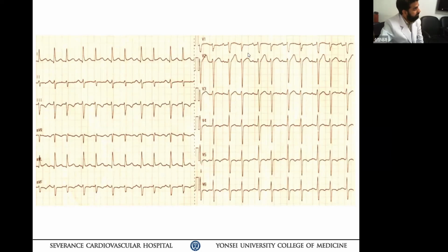Yeah, it's a narrow QRS, but slightly wider if you see one. Can you measure? I cannot see the grid. It's longer than 120 milliseconds. The first and second QRS look different, slightly short, around 20 milliseconds.